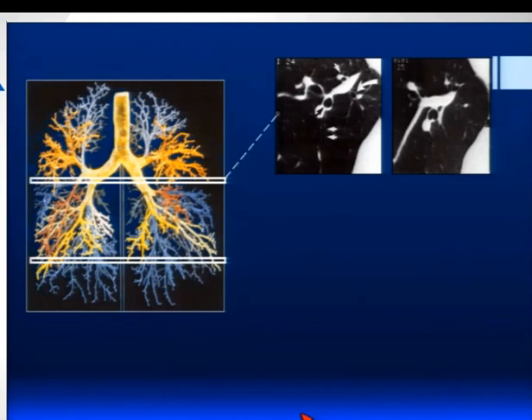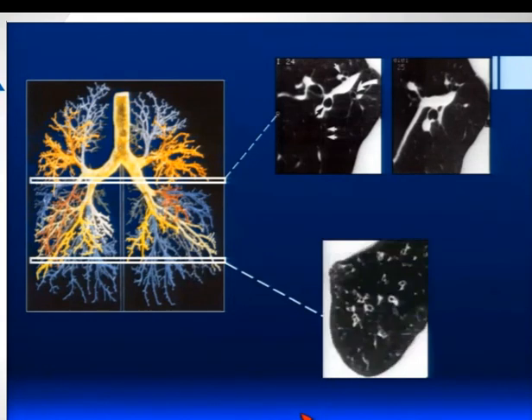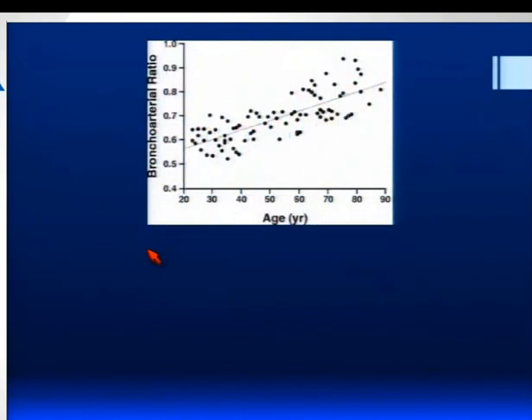The airways that you need to look at, as I've already said, are the airways which are roughly orientated perpendicular to the plane of the section. Then, when you have dilatation, you can say with a reasonable degree of confidence that this patient has bronchiectasis. Be careful before you make a diagnosis of bronchiectasis in these very central airways. Where else do we get it wrong?